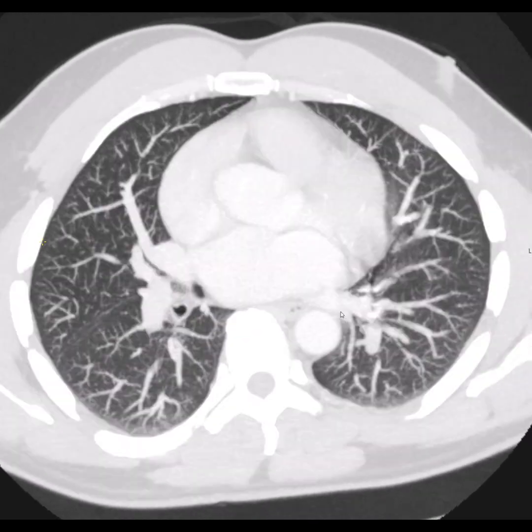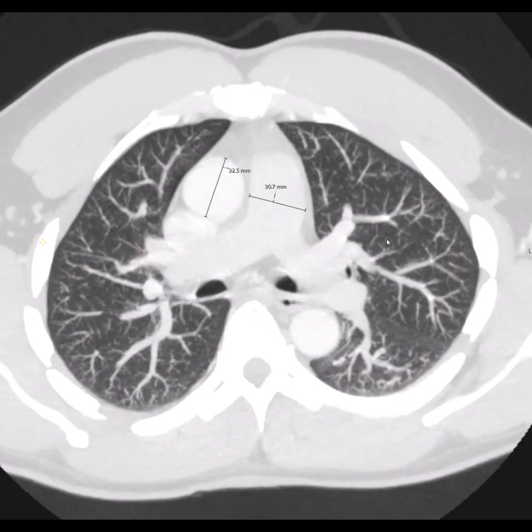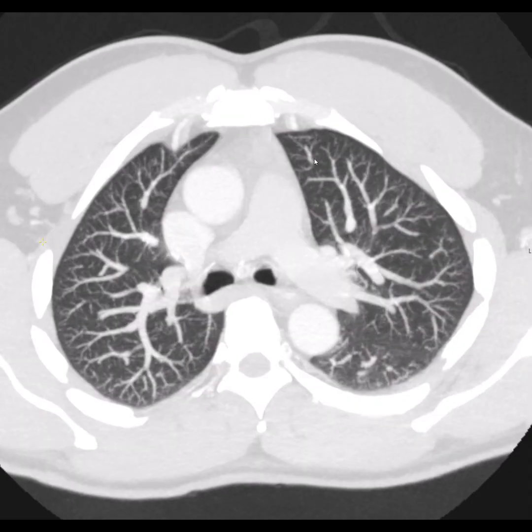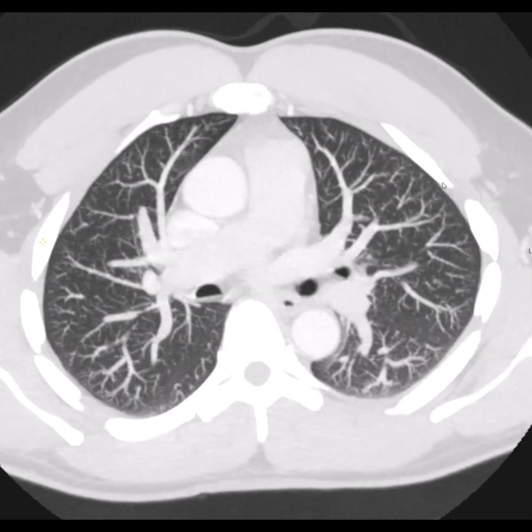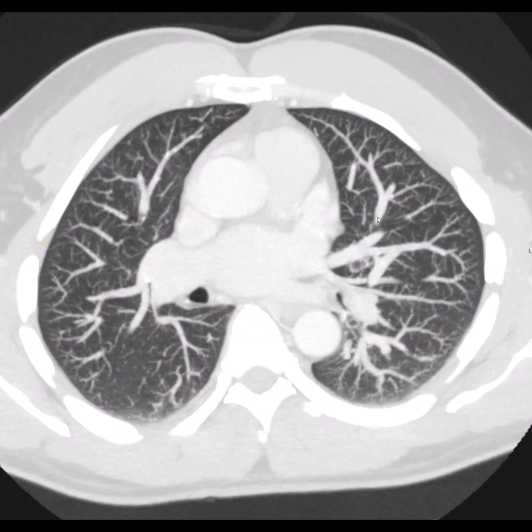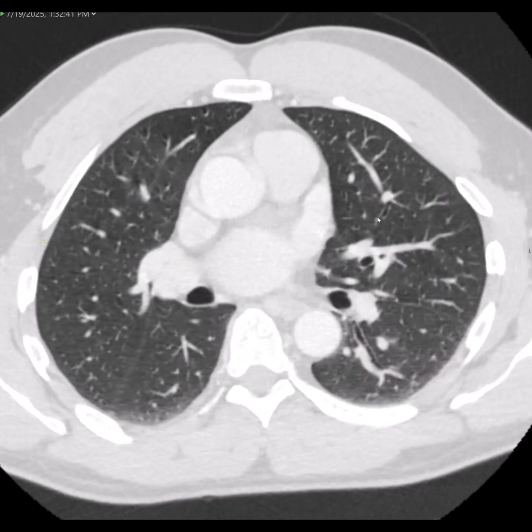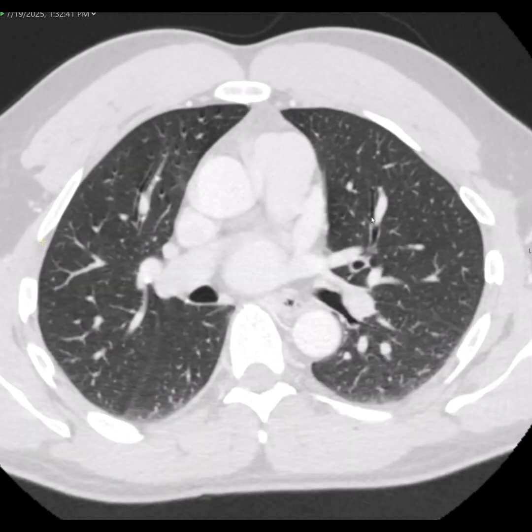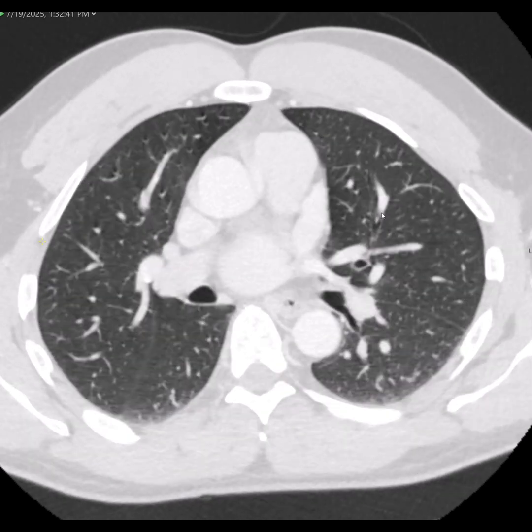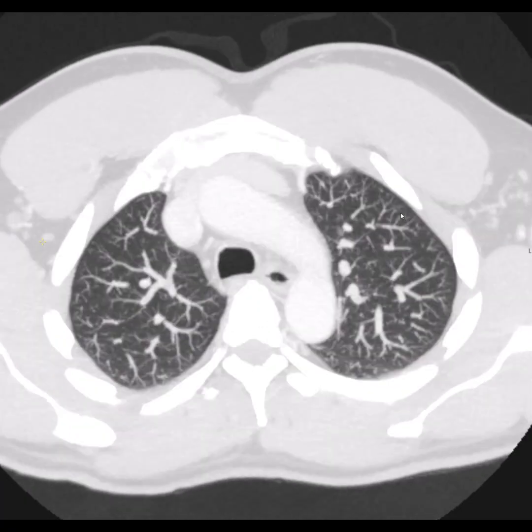And then hopping over to the left lung, same thing, starting at the top lung region, looking for any nodules, anything that comes in and out of view. Here it looks like there may be something, but it's kind of following along the line of an airway, so it's probably just part of the lining of the airway.